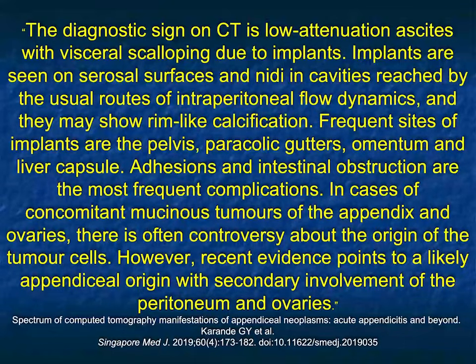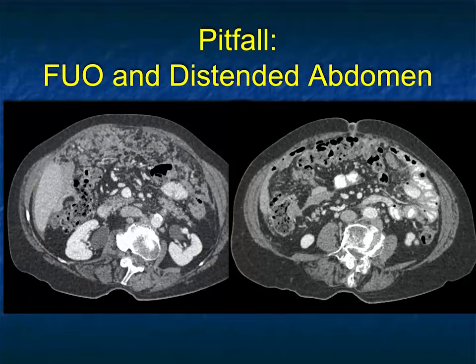If you see a mass in the appendix and it's large and it enhances and it has calcification, you would worry that the patient doesn't just have appendicitis, but perhaps has a mucocele. It's often a very difficult diagnosis, and it's typically made at pathology. Here's another patient who looks like pseudomyxoma peritonei, with impressive nodularity in the omentum and mesentery.